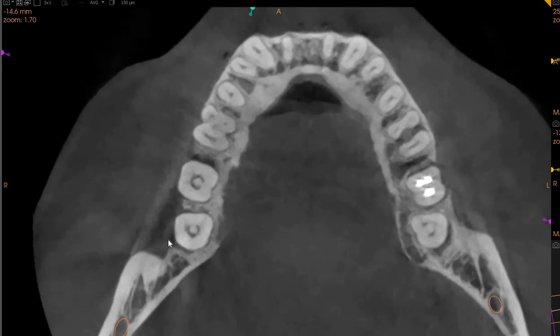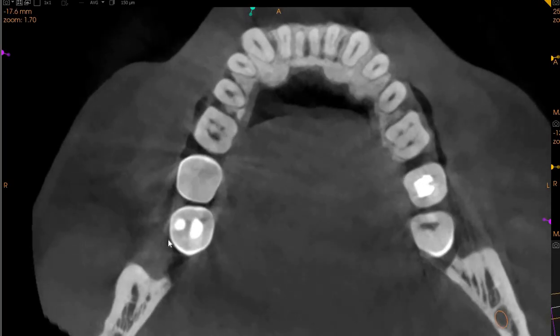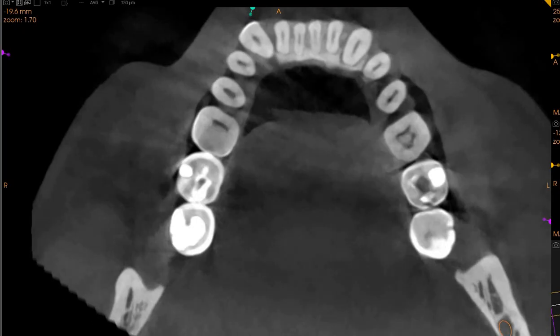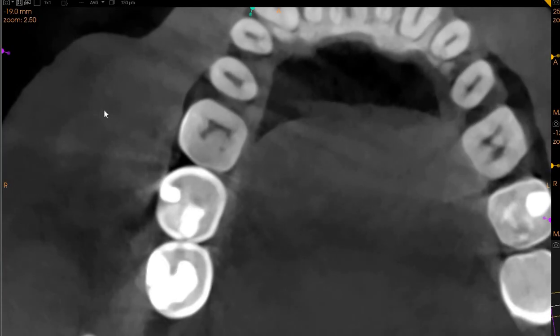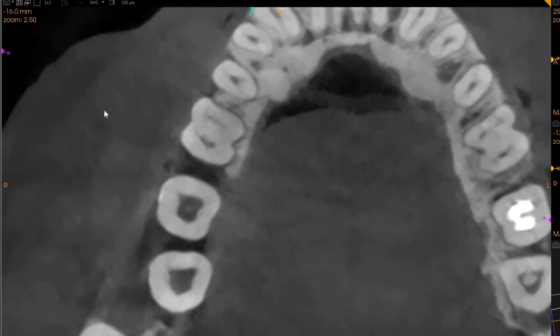Now, considering all of these, let's go back, slightly zoom in further if we can, and then let's try to look for cracks on this view again. Again, nothing spectacular can be seen, but right here is where we can see something on the lower right 7. There we go, that's one, and then we'll mark the other part, which is right here.